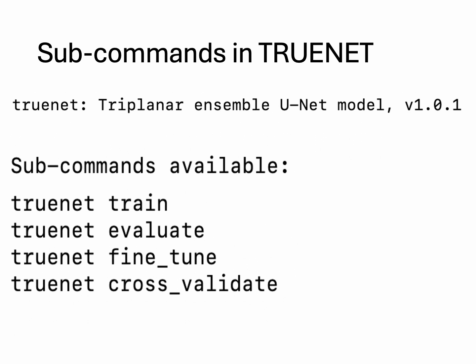Right. So now the subcommands in TrUE-Net. These are the subcommands currently available. We will go through them one by one. The first one is the train module, where you train the models from scratch. The second one is evaluate. If you have a pre-trained model or if you have trained a model recently, you can just apply the model and get the segmentation performance on a specific data set.